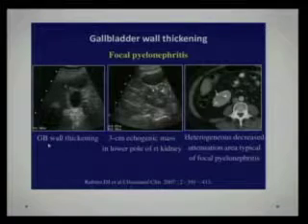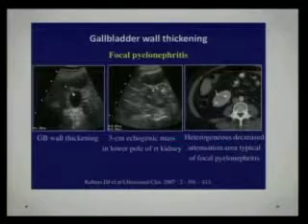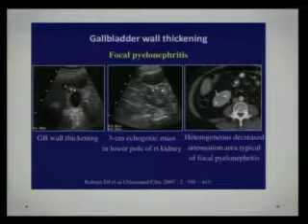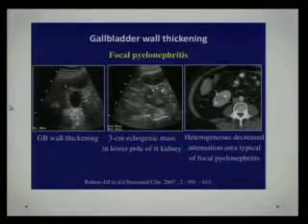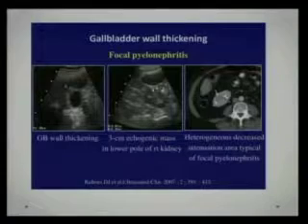Coming to gallbladder wall thickening in patients with acute pyelonephritis. Well, let's look here. This is gallbladder wall thickening, and if I had to choose which one it was, I probably would say it's the last one. It's striated. There are multiple echogenic and hypoechoic layers here. In the adjoining kidney, there's a 3 centimeter echogenic mass in the lower polar region of the right kidney, and that, of course, represents acute pyelonephritis.